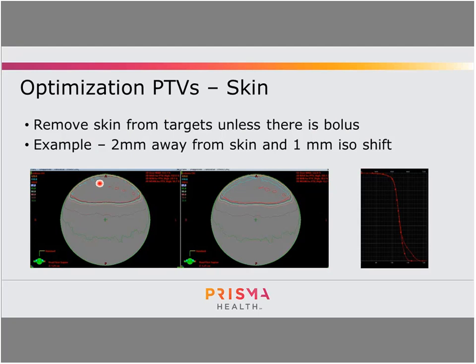But what this is doing when it's actually optimizing is you're not getting a lot of beams coming straight in through this PTV, because if you think about it, the photons have to build up. So you're going to start to see a max dose 1 to 2 cm down in here. And so what that means is if you just had an AP beam here, you would have a dose max around here, but only like 30 to 50% at the surface.